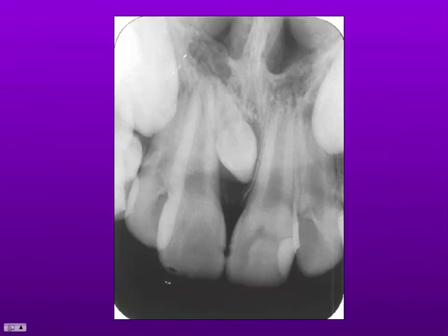The commonest type of hyperdontia that you probably come across as a dentist, though, is a small rudimentary peg-shaped tooth developing around the midline of the maxilla. This is a mesiodens. So remember this shape, this appearance. It's relatively common. You may find these just by chance on radiography, because very often they don't affect the eruption of the adjacent teeth, typically because they're rather palatal to the roots of the developing teeth. But if they are centrally placed in the arch, they can interfere with eruption.